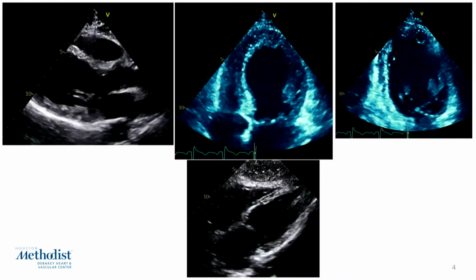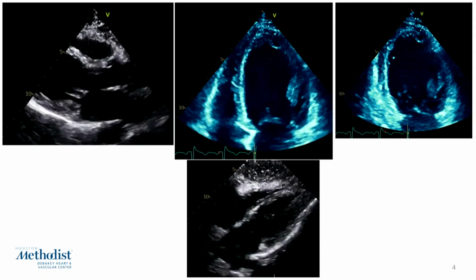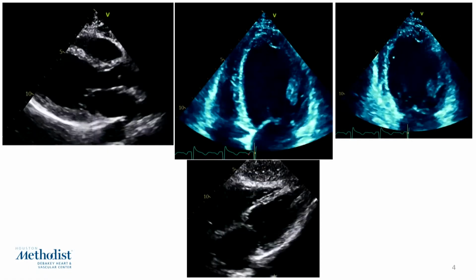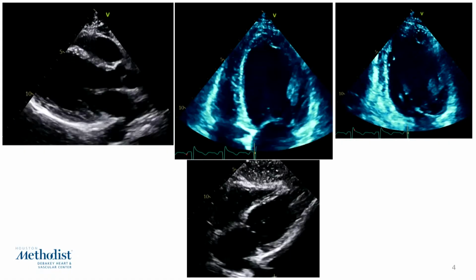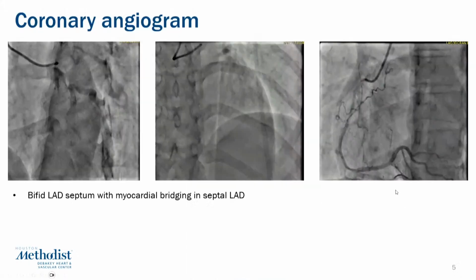And again, maybe 30 years ago when it was not a very well-recognized disease pattern, people were more worried about it, but now over the last maybe 10, 20 years, we have increasingly realized stress-induced cardiomyopathy is way more common than we think. And one thing that we have to do, even in stress-induced cardiomyopathy, is to make sure that the coronary anatomy is well delineated. So that was done in this patient.